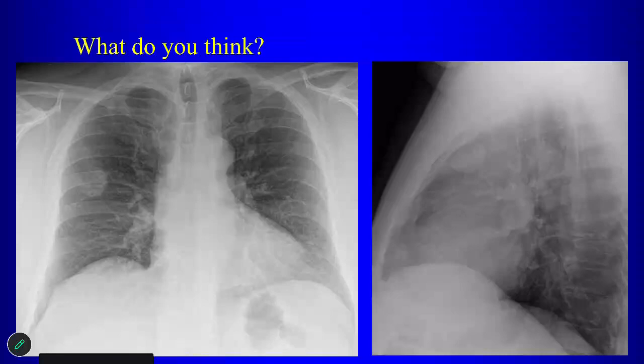Why not? Mesothelioma would be more widespread. In almost all cases, it's also associated with pleural effusion. So it's a more extensive tumor. There was a term, it used to be called benign mesothelioma, that should be in the differential for this. What tumor am I thinking about? Solitary fibrous tumor of the pleura, right? They're not all benign, but this could be a solitary fibrous tumor of the pleura. So that's also in the differential.